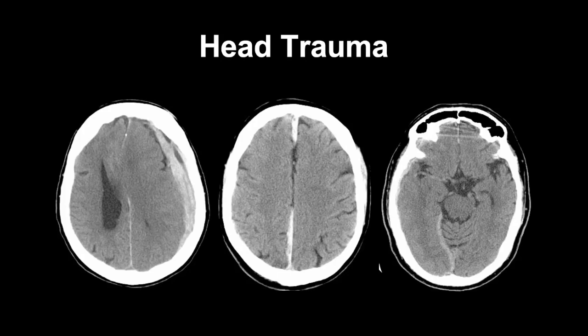Second thing, subdural hematoma can occur in the absence of any kind of fracture, and they typically tend to happen at the side of the contrecoup. So you are going to see the skin contusion on the contralateral side to the subdural hematoma. That's also different from the epidural hematomas that happen at the site of the coup underlying the fracture.